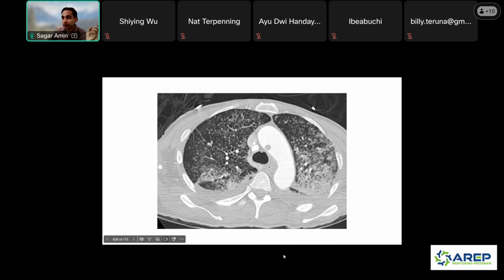And then this was actually the same patient. They had HIV/AIDS, and then they came back and developed all these nodules everywhere. Some of them are touching the pleura, some of them are scattered. It's hard to tell, but some were touching the fissures as well as being everywhere, and they were small. And then there's some consolidation and ground glass opacities on the left side.